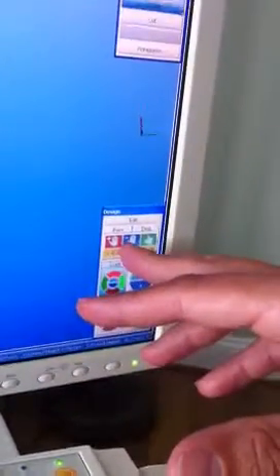The scale is for manipulating large areas of the tooth, forward and backwards. The form is just for very small parts of the tooth. As you can see with the scale, you can't actually just click on a part of the tooth. You have to utilize your lines of reference to mark it. So I have to have the arrow on a line. That's important.